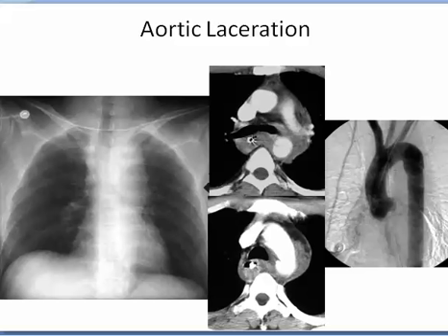And here we can find that there is widening of the mediastinum due to hematoma or something leaking in this area, denoting aortic laceration.